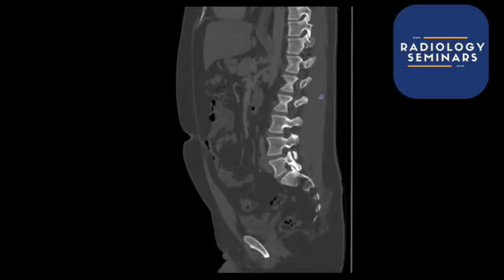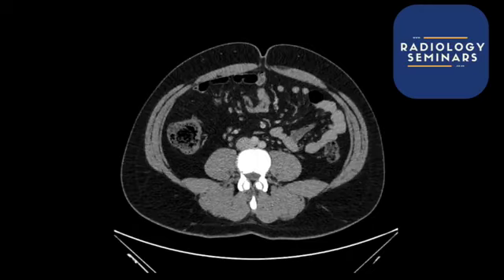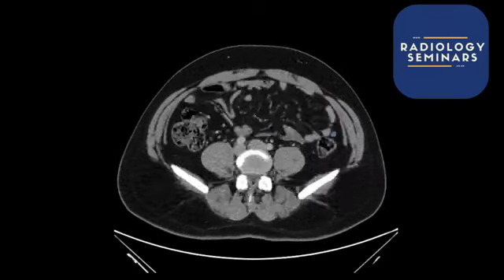I hope everyone's having a good time with this live session. I hope it's coming across clearly and we're all learning something. But anyway, I went to sagittal views, and just take my word for it, there's nothing wrong with the sagittal views of the bones.